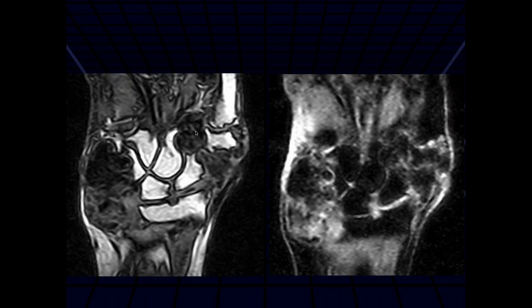So wherever you have these lesions, you're also getting bony erosive changes. Right, there are multiple lesions.